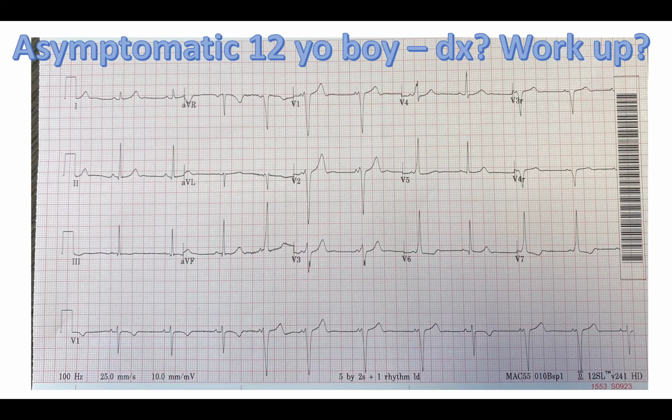So I'd be concerned that this patient has WPW, given that there's pre-excitation. So you are canceling your first comment about PVCs and are settling on pre-excitation, WPW. Yes. Am I accurately representing your view on this EKG? Yes, correct.